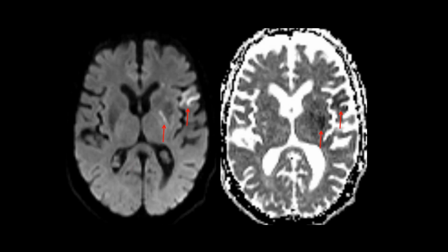After being stabilized in the ICU, the next day our patient is taken for an MRI. DWI shows a few small areas of hyperintense signal in the left basal ganglia and inferior left frontal lobe, with corresponding hypointense signal on the ADC map, and these indicate that there are a few small acute infarcts. Fortunately, this also suggests that nearly all of the MCA territory was saved.